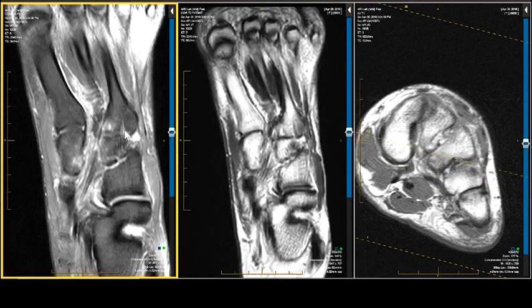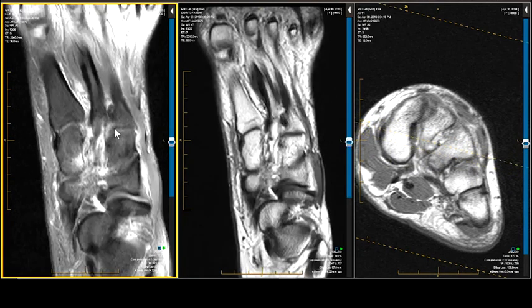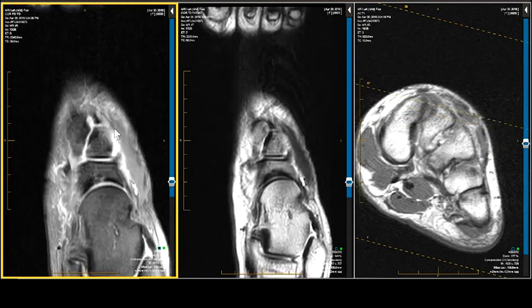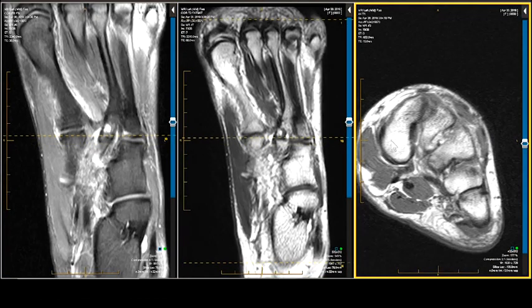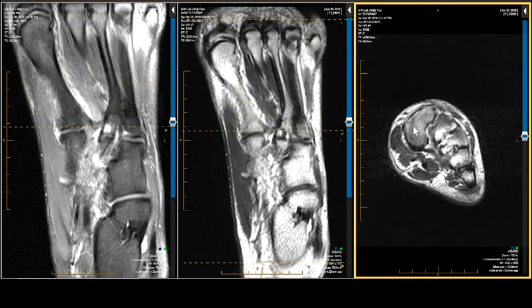Then I'd also go out there and talk about the fractures and the microtrabecular fractures that are present. And that would probably go in the body of the report, and in the conclusion I'd just say something like innumerable chip and microtrabecular fractures consistent with a midfoot sprain and Lisfranc rupture. So one sentence. Now you can see the Lisfranc ligament in the short axis view if you're used to it.